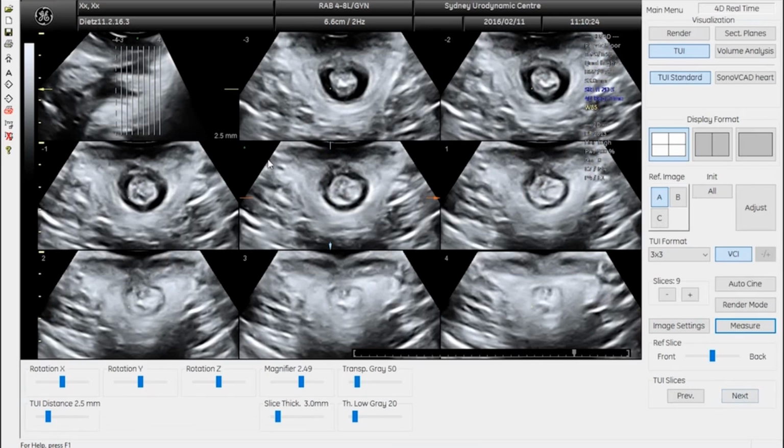And in terms of rating that sphincter, I'd say that's actually a fairly reasonable repair. Just visually, it's a fairly reasonable repair after a 3C tear, but there is still a substantial residual defect for the EAS in 5 out of 6 slices. For the internal sphincter, I can see a residual defect really only in this slice, because that one doesn't count, and here you might still be accepting of this being reunited effectively.